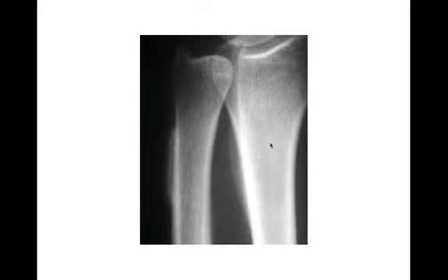All right, another radiograph here of the distal radius and ulna. Here we see this laminated periosteal reaction along the radius and to a lesser degree along the ulna right here. Very focal, heaped up right here, these alternating layers of sclerosis and lucency and sclerosis. This periosteal reaction was due to HPOA, hypertrophic pulmonary osteoarthropathy, usually due to some underlying thoracic process. Often it could be a lung cancer, though it doesn't have to be; any kind of thoracic process can cause this sometimes. So this was a periosteal reaction from HPOA.